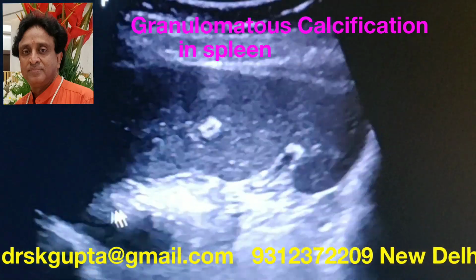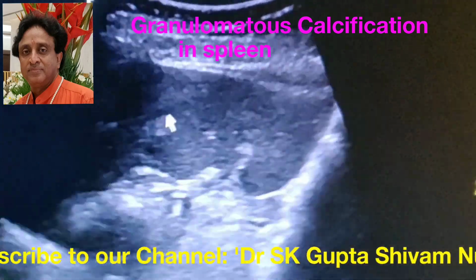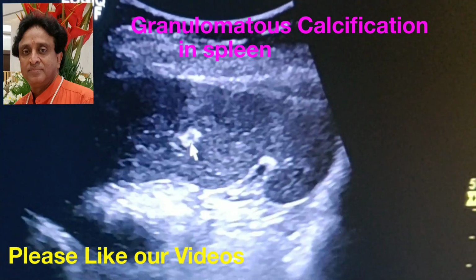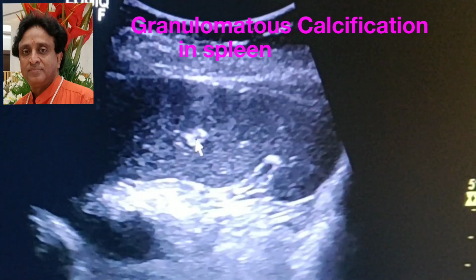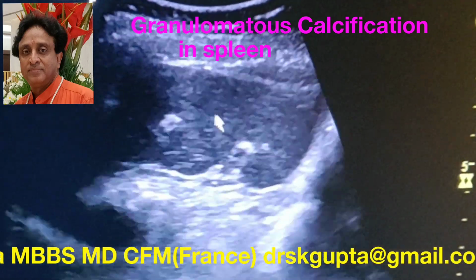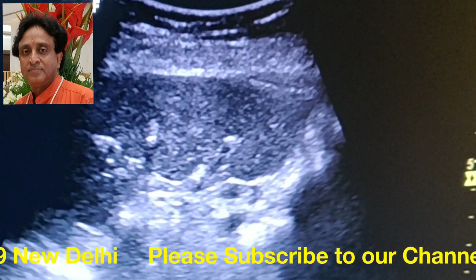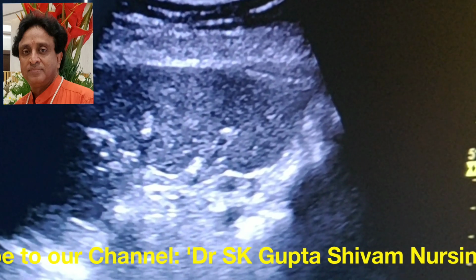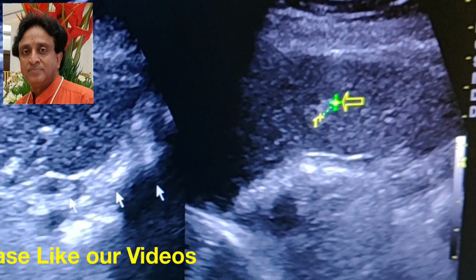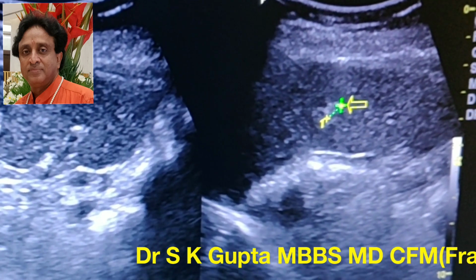This is the spleen. You can see that this is the splenic artery, and the 2 small foci of calcification which are seen. They can be because of the calcification of the angiomas, or they can be granulomatous calcification in this patient, and they are different from the rest of the case that I showed you earlier. But this punctate calcification, this is slightly bigger in size, and you see 7.4 millimeters in width, and this sort of calcification may also be seen in the spleen.